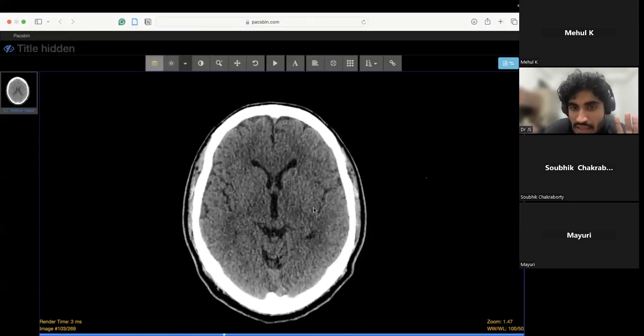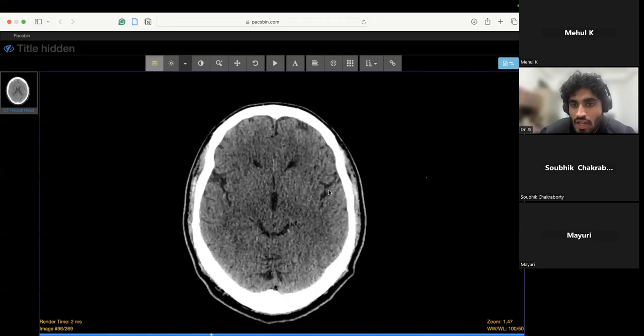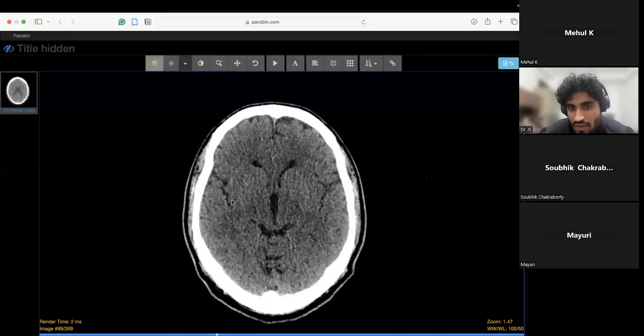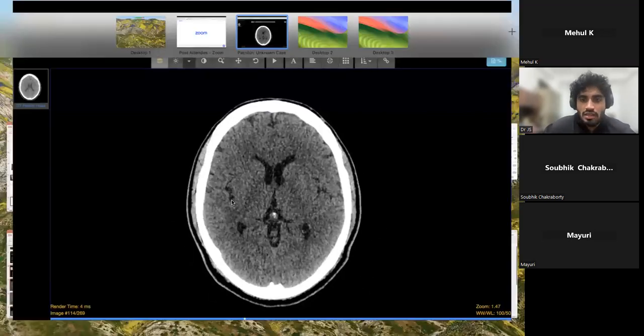So there is a Mickey Mouse here that is suggestive of the midbrain, and it is looking like a star. If the star is white, that is abnormal. If the smile is white, that is abnormal. If these two are not visible, that is also abnormal. And similarly, these Sylvian cisterns should also be black color. So that is how we need to see. There should be a smile, and it should be black color. So that is the SH part.